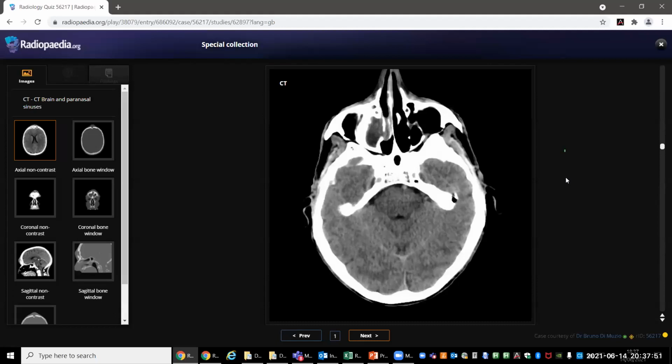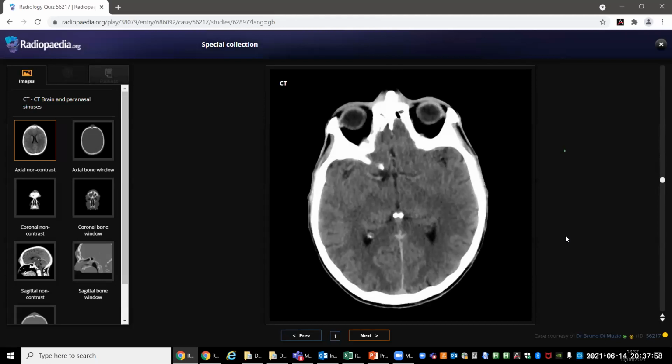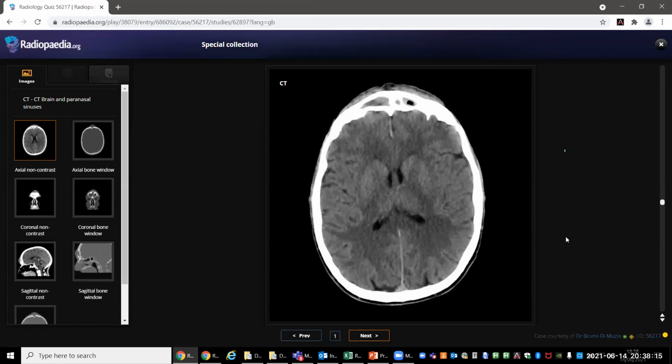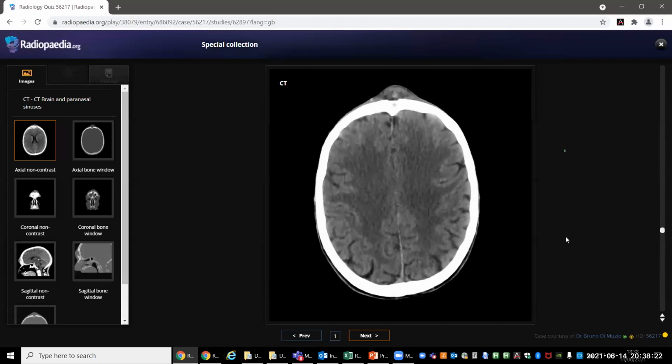So within the impression I have from these, apologies, my screen gets stuck, maybe some internet issues on my side. I would also like to add that there is ethmoid sinusitis as well, and I do not see any soft tissues in the intraorbital component. So in summary, with the findings I have mentioned, this seems to be a case of sinusitis with involvement of the soft tissue component as well.